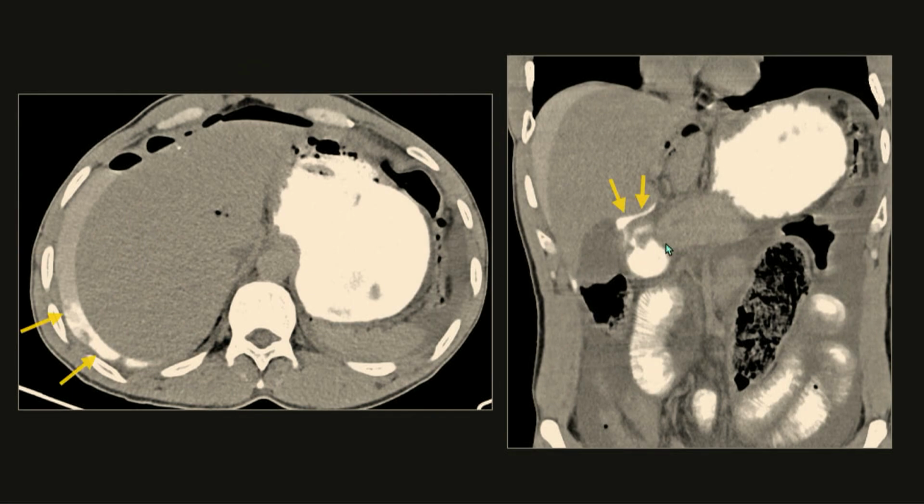Here's another patient who also couldn't get IV contrast, but got oral contrast and admittedly drank what is probably a heroic amount of it, given how much has leaked out. But that does show that defect really well here of the duodenal bulb, and then some of that variable density layering within the enteric contents along the liver edge.